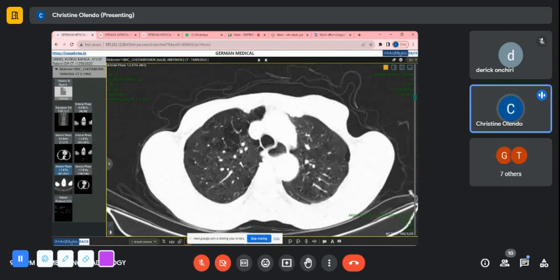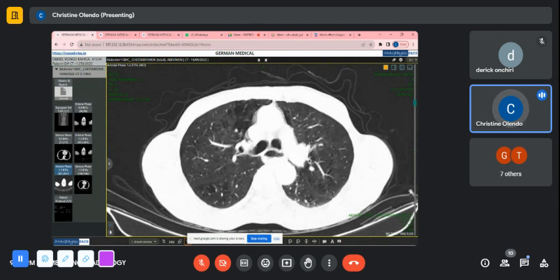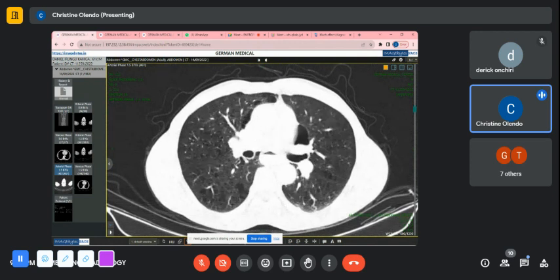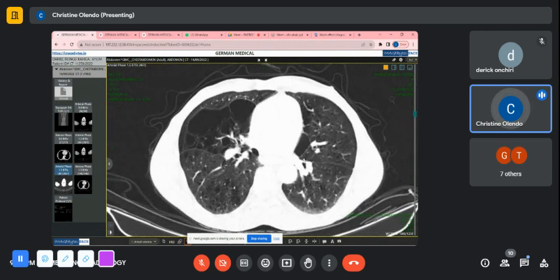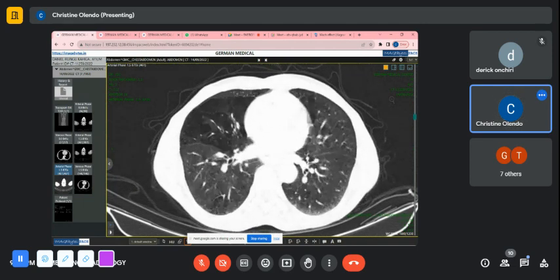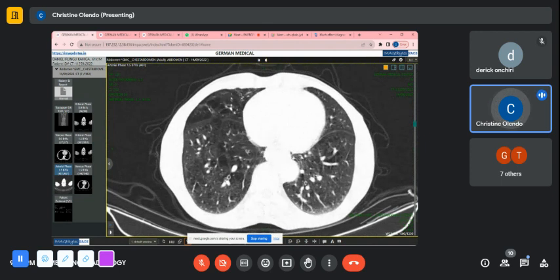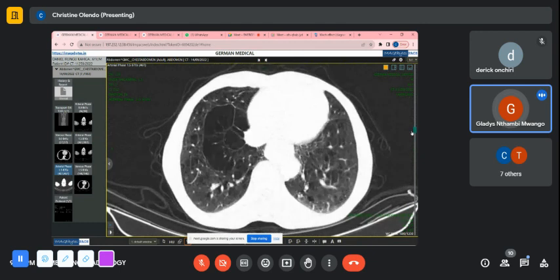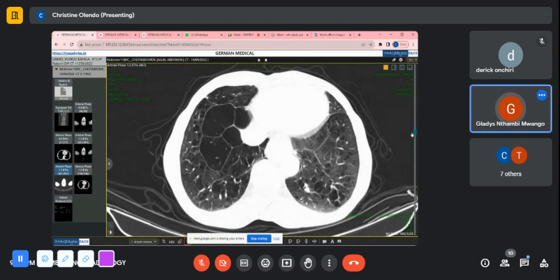They're seeing the emphysematous changes, septal and some are centrilobular. This was the initial one. Going all the way down, it was larger once you went to the lower zones. But my question initially was... It actually has almost even the panlobular type, huh? Okay. Emphysema, yeah. Were you asking if this is a bullae?